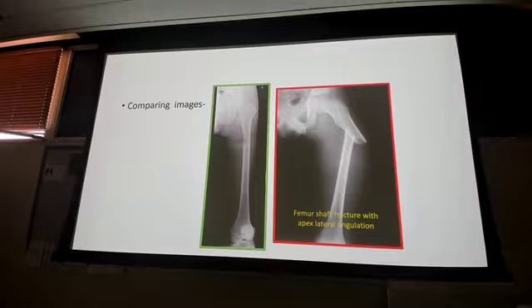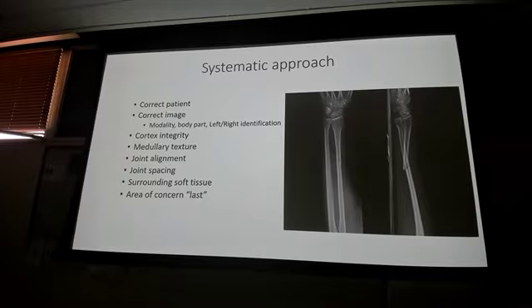Apex lateral angulation, is that a right or a left femur? Left. You have enough context clues. Okay. There's the owie. Shortening, also okay, if you want to use shortening on this, right? If you wanted to use medial displacement, also okay, because the distal fragment is displaced medially from the proximal fragment, also okay. Right? Okay.